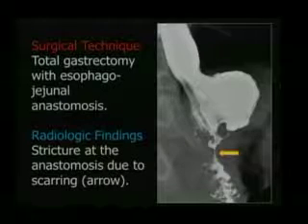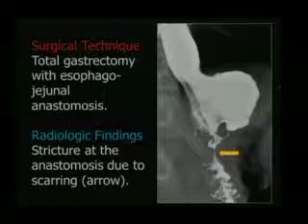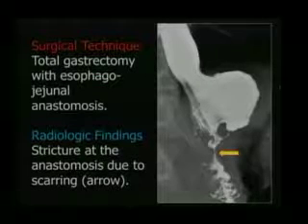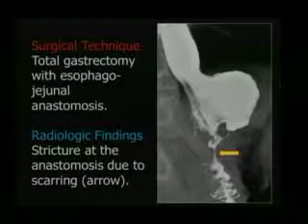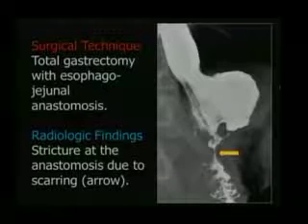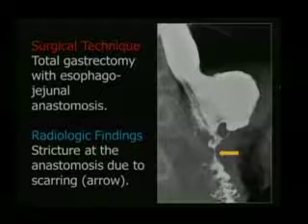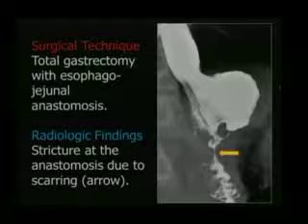Is that residual cardia? This here? That blob, that little outpouching right there? Is this residual cardia? Yes. I would be very much concerned when you see those lumps there. Yeah, I made a mistake. I said the stomach, and it's really malignancy. I would be very much concerned when you see tissue growing into an anastomosis, or malignancy.